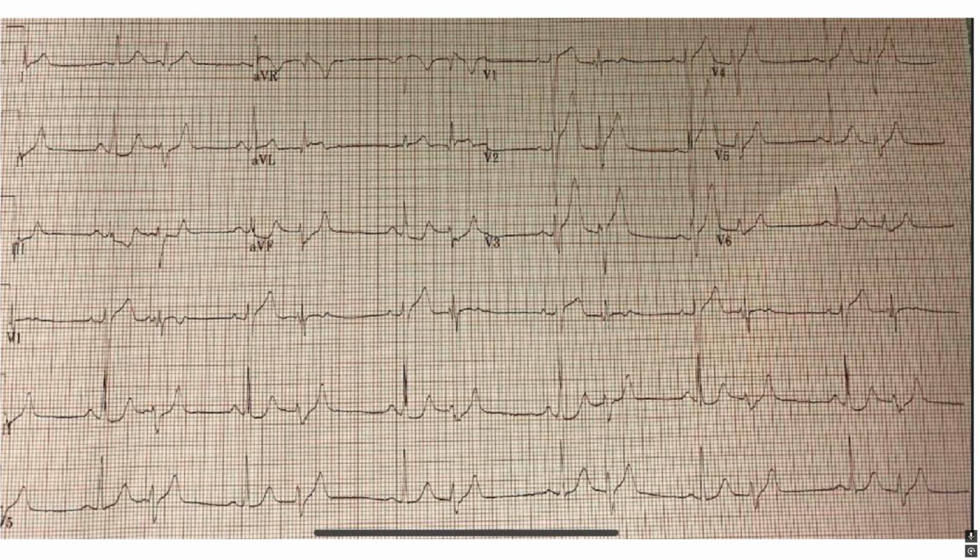For my intervals, the QRS is not over 3 boxes, and the QTC does not seem prolonged. For my axis, let's see what my native beats are. These here are my native beats. These ones are the PVCs. So it's up in aVF, and my native beat is followed up in lead 1, so a normal axis.